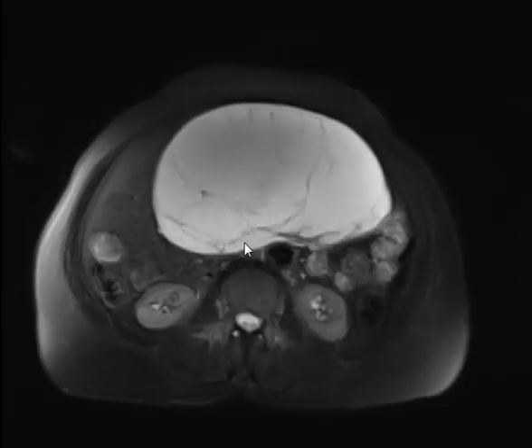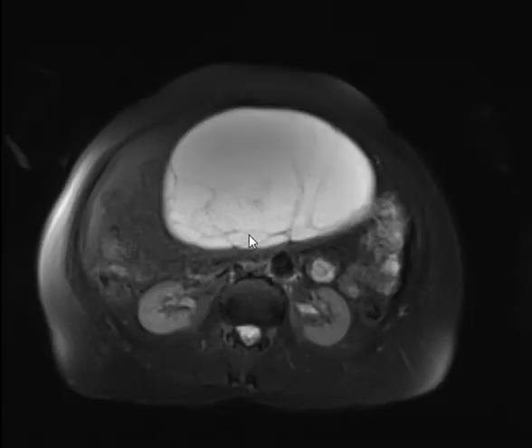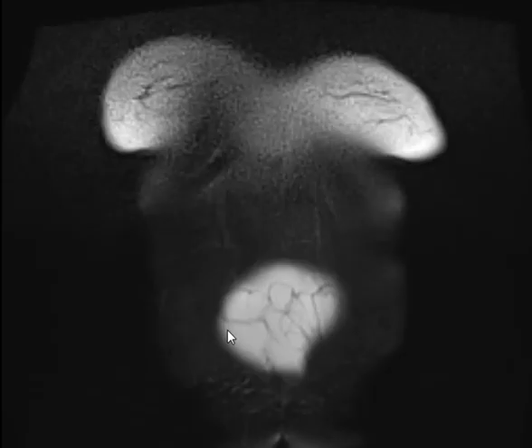As far as I see, it's inside the liver. First of all, you only saw one sequence. You have a lot of sequences. You can use other sequences to confirm or exclude, so don't hurry to jump to the diagnosis. So first of all, it's a cystic something, large, well defined.